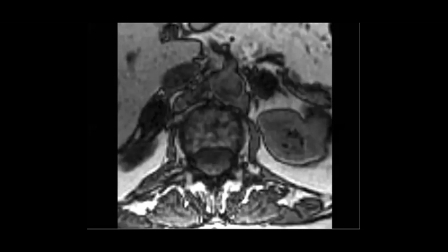Cardiac myxoma, carcinoid, liver metastasis, otitis media with sigmoid thrombosis, focal nodular hyperplasia, subcapsular hematoma renal, fracture wrist, metacarpal hamate. Okay, and I think you mentioned mesothelioma, left cardiac myxoma, silicon granuloma, cavernous internal carotid artery aneurysm. Okay, I think I read all that you wrote.